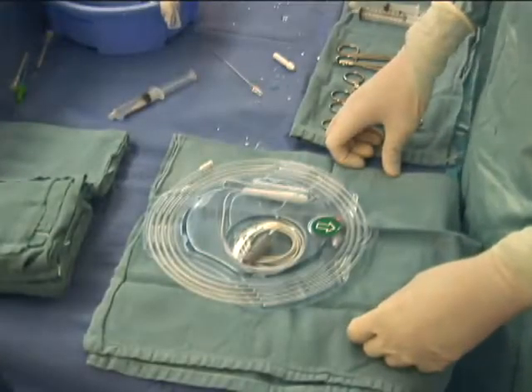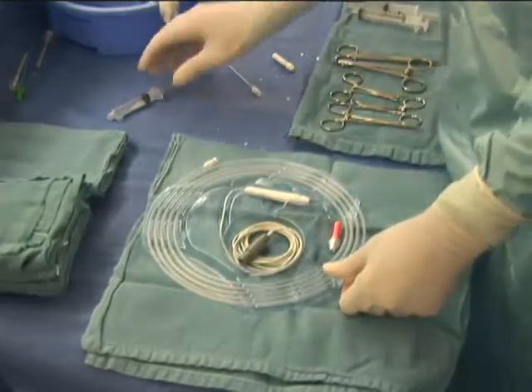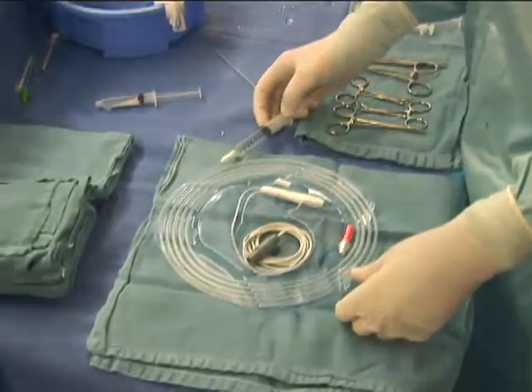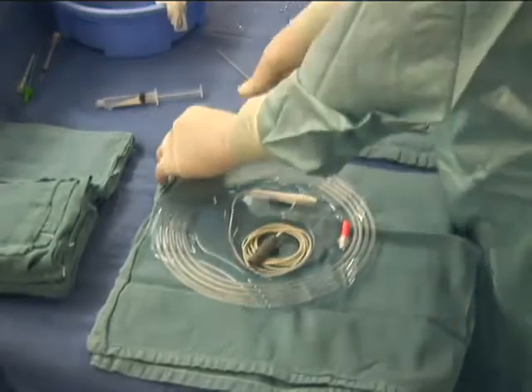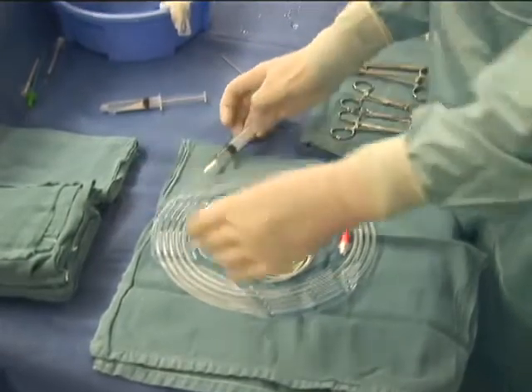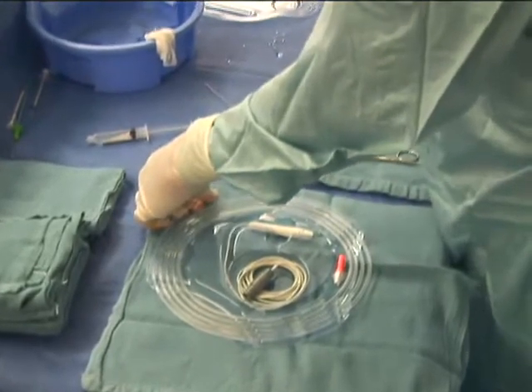The FFR wire is prepackaged in a plastic hoop. On the distal end is a floppy wire tip where the pressure manometer is integrated into the wire, approximately 2 to 3 centimeters from the tip of the wire. At the proximal end of the wire are a wire torque device and an electrical interface plug, which attaches to the FFR console where hemodynamic tracings are monitored.